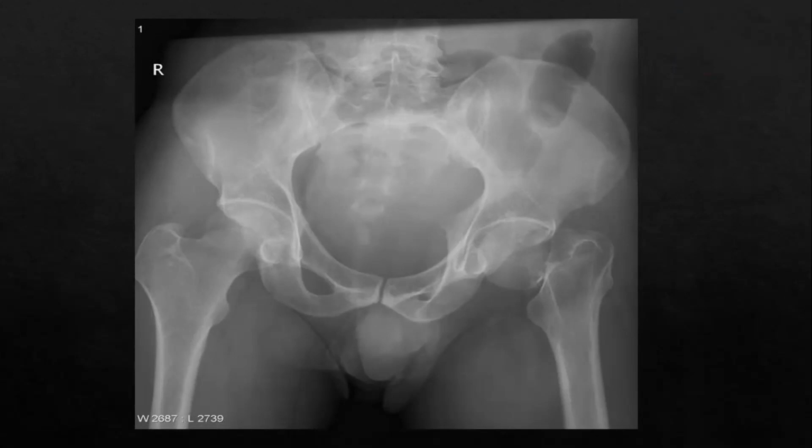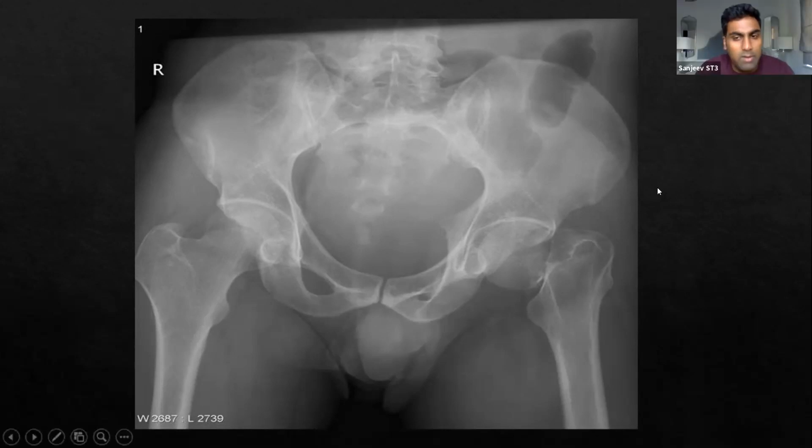So is that like whether it's displaced or not? Exactly, yes. So the fracture itself doesn't seem to be displaced, I don't think. Yeah, so there's probably minimal displacement. That's the phrase I would use because it's not completely undisplaced.